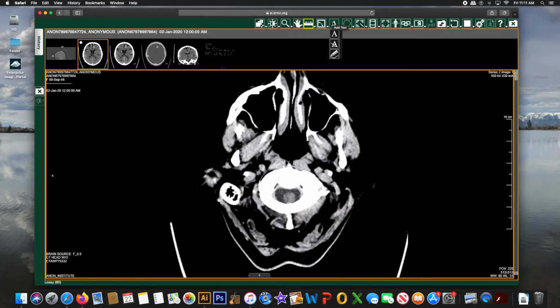The annotations tool is used to enter free text on the screen. Just click on the image and type in your free text and hit enter. Your text will now appear on the screen. To remove it, you can right-click on the text and it will disappear.